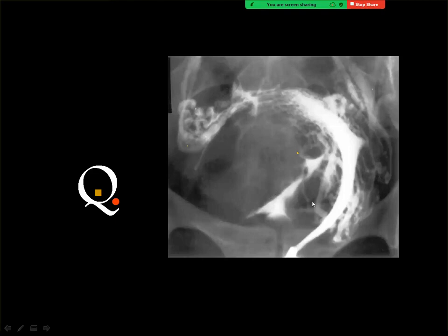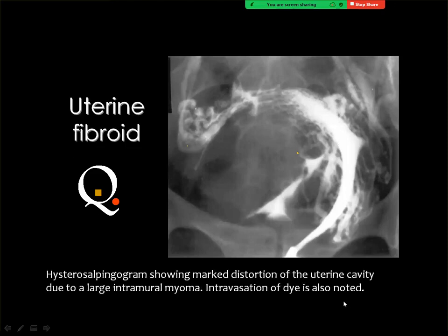realize that the ovarian tumor will not stretch the uterus along its border. It may displace the uterus or may elevate the uterus, but will not stretch the uterus along its margin. So if you see that the uterine margin is markedly stretched like this, you know that this lesion is of uterine origin, and the lesion which can give this appearance is just a fibroid uterus.